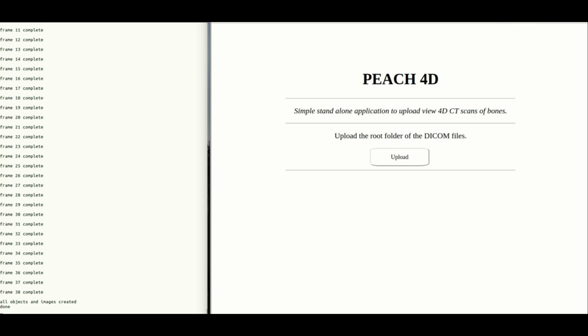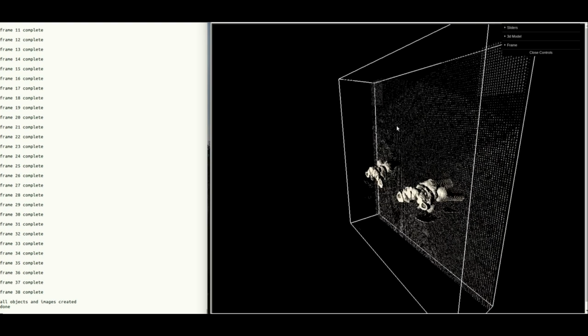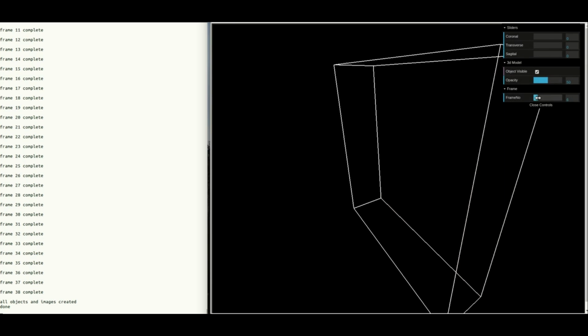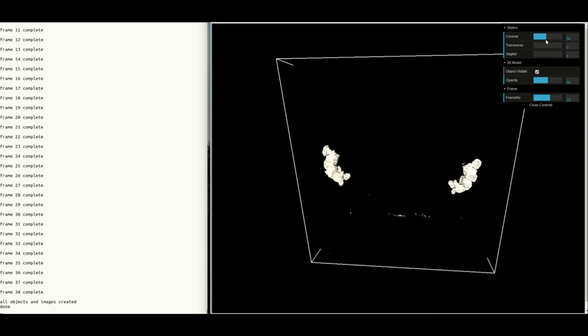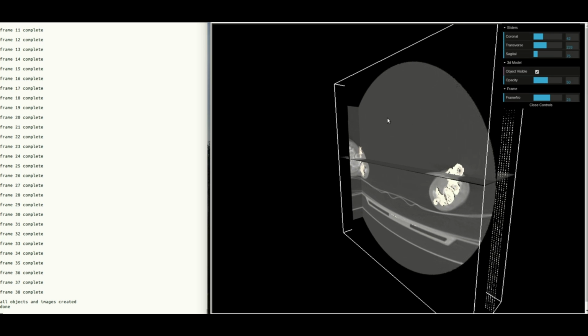So now they're all done, reloading the viewer page on the right shows the mesh loading very quickly. We've got orbital controls so that we can see it from all angles, and we've got 3 sets of controls. We've got a slider to change the frame, we've got a slider to change the opacity of the mesh, and we have sliders showing the JPEGs that pertain to the DICOM slices in the 3 planes. These are positioned to overlap on the mesh, as you can see.